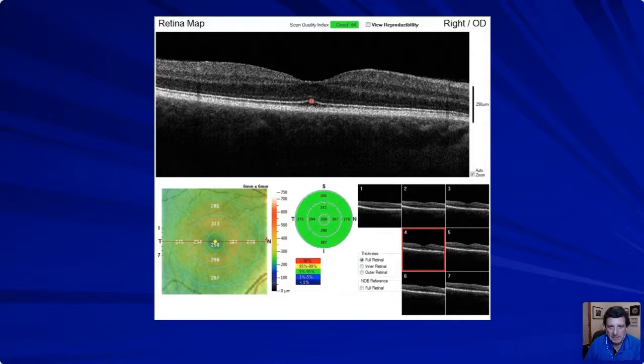And even here, it might be a little kind of scary. Is this a disease process? What's going on here? Looks like, or is it just a low quality scan? Because they're starting to become maybe not as robust in highlights there.